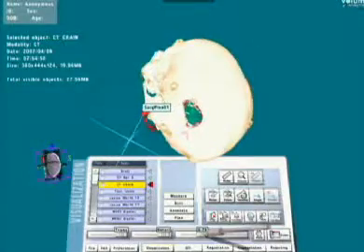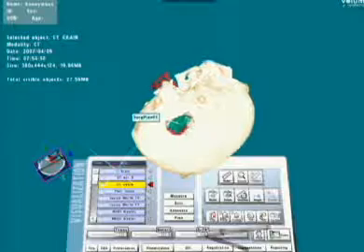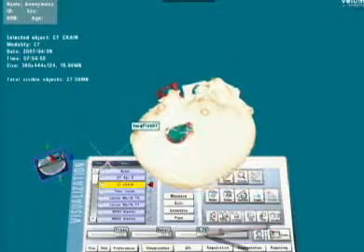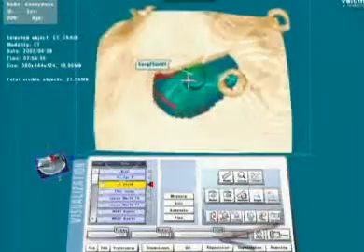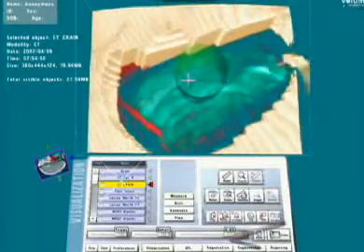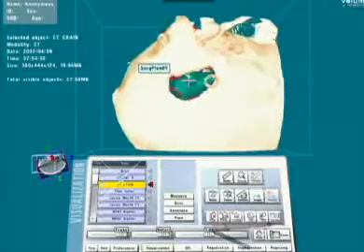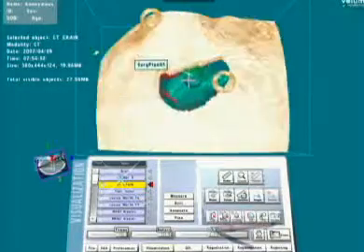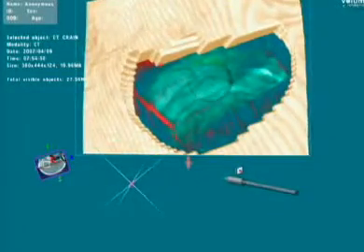This turned out to be a low-grade oligodendroglioma. We seem to do a lot of that in our practice. Here we have a tumor as indicated in green. Here we have a CT scan. This defect was actually produced preoperatively by using the drilling tool that's a part of the Dextroscope package. We were then able to drill away and show the tumor.